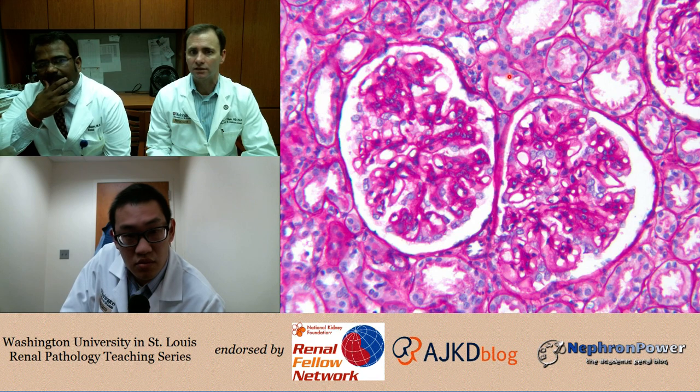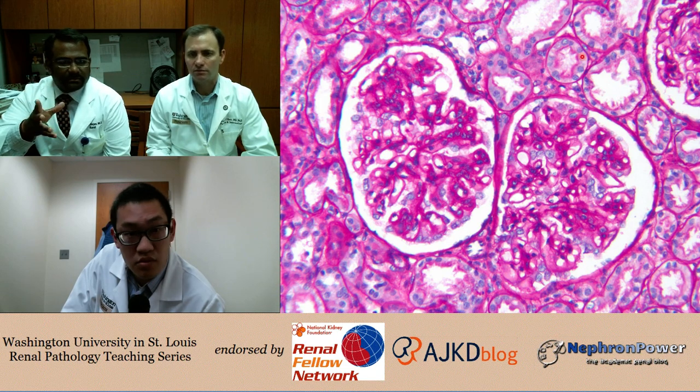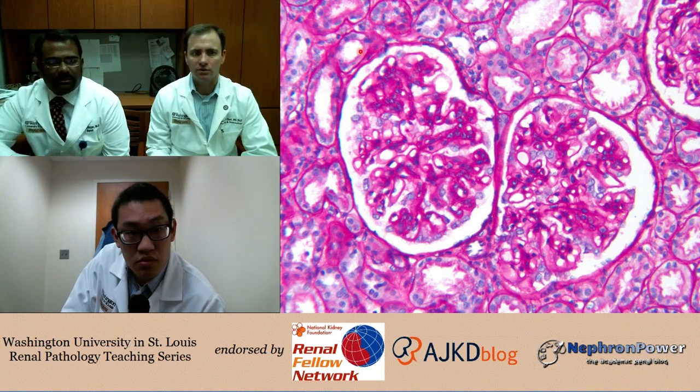And then looking at the tubules, here's our nice brush border highlighted on this PAS stain, and they're relatively back to back, and I don't see anything. There's not much going on. There's no inflammation. There's no significant fibrosis. And the tubules look pretty unremarkable.